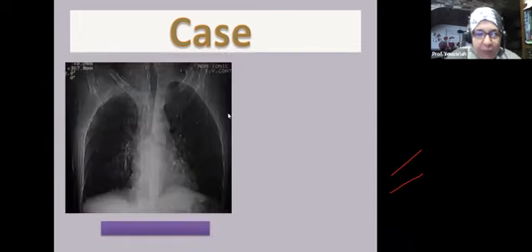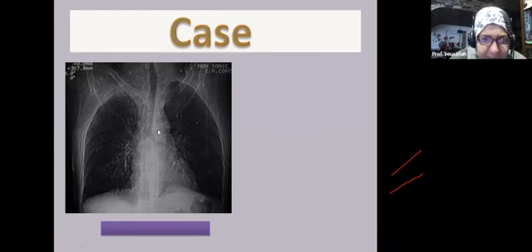Now, look here, this is a chest scanogram. Look at the left side, you can see the apex of the lung clearly. If you look at the right, you cannot discriminate the apex because there is an apical cap here. Is this an effusion? No, it is not an effusion, because apical capping of effusion is associated with veiling of the lung. We don't have veiling. The lung is clear, but we have a cap. So there is a pleural lesion here, apical thickening here.